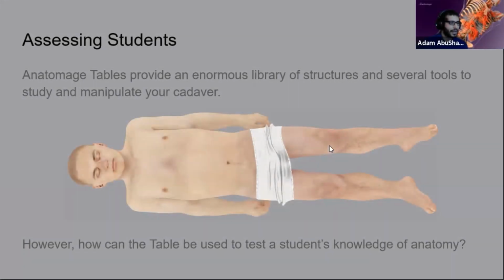As you've seen, Anatomage offers a wide variety of tools and structures that are available to view within the table. And we have different types of manipulation with the clipping tool and the drawing tool, pen tool, all these great things to help you learn anatomy.